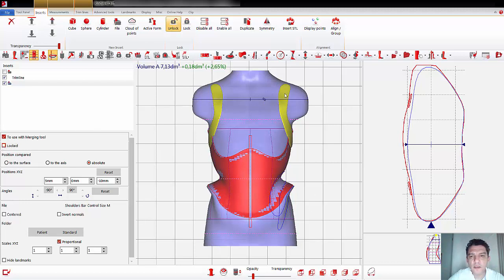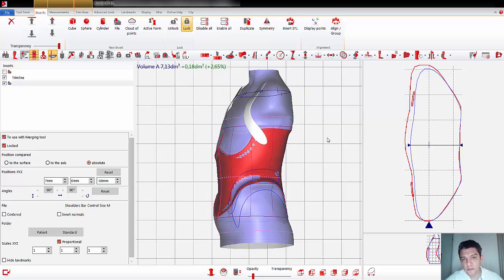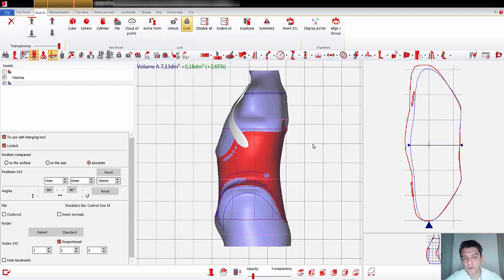Probably, let me try, because probably we can do something like this. Okay, so in a real case, normally I mill the red part with the robot die cut, where I have the trim lines, and after, I take from my facility the metallic bars with the joint to fix over here, and you can control very good.